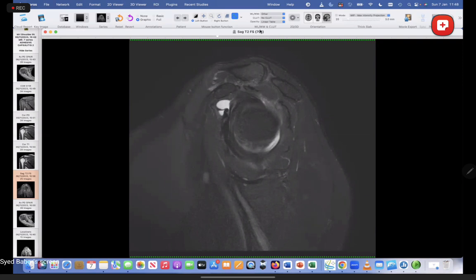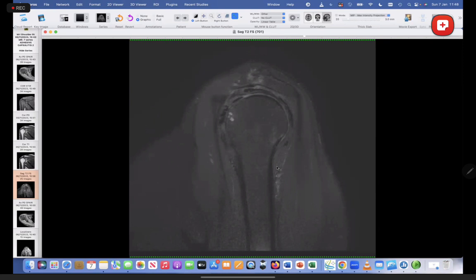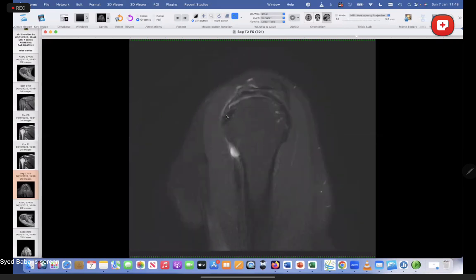Teres major? Which major? Teres major, the lady between the two ladies. Latissimus dorsi surrounded by two majors. So they have to be somewhere way down here. So teres major is somewhere here, because remember, it attaches to the humeral shaft, not to the tuberosity.